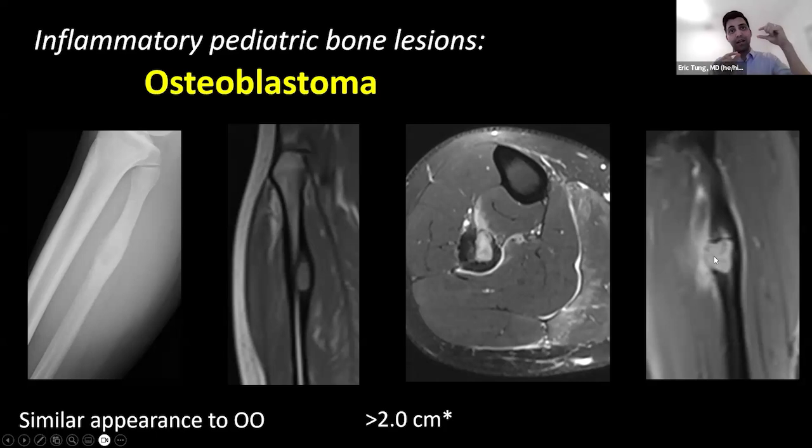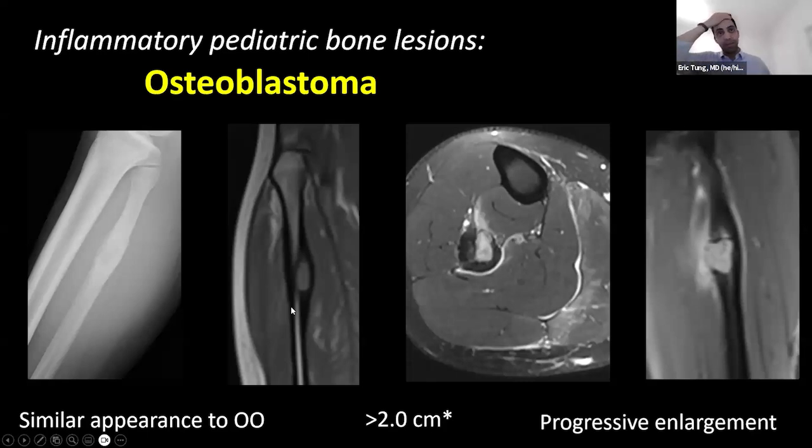They're not this elongated, stretched out shape like those elongated osteoid osteomas, but they're kind of more rounder. But they can have a very similar appearance to osteoid osteoma, both on imaging and on pathology. But one of the classic features that may differentiate an osteoid osteoma from an osteoblastoma is if there's follow-up imaging, osteoblastomas tend to grow, while osteoid osteomas really tend to stay at a similar size.